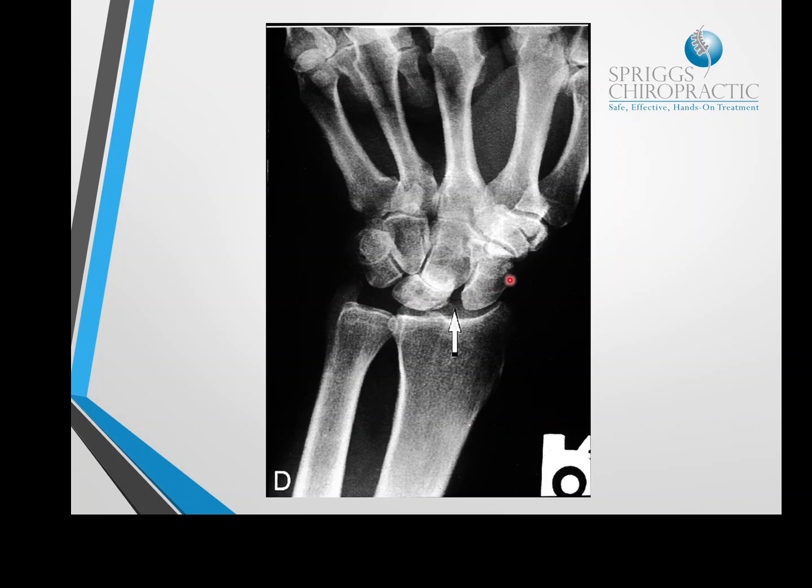So obviously it obliterates the soft tissue involvement there. So there probably is a bit more calcium to be seen, but because it's going to be such a thin layer of calcium, it might well be that the contrast has just removed it from the image, so you're not going to be able to see it.